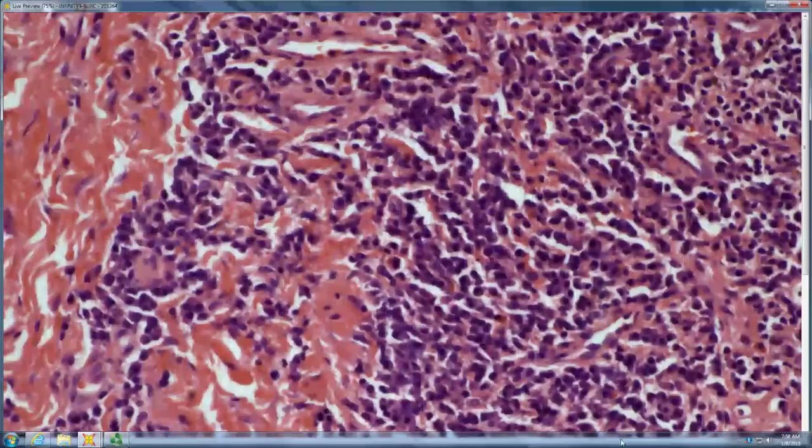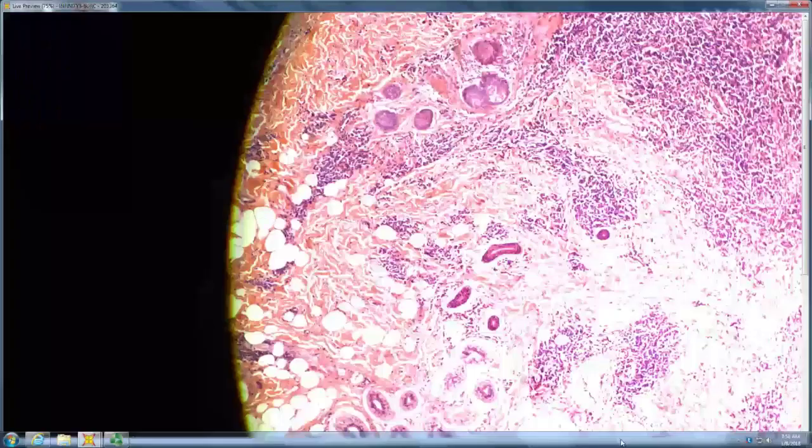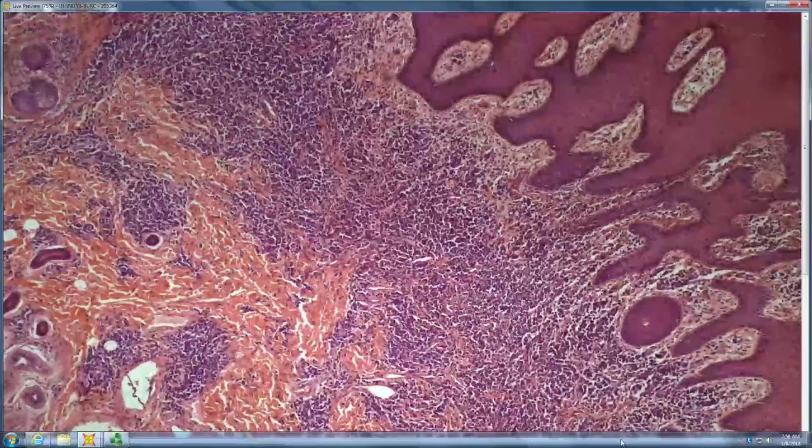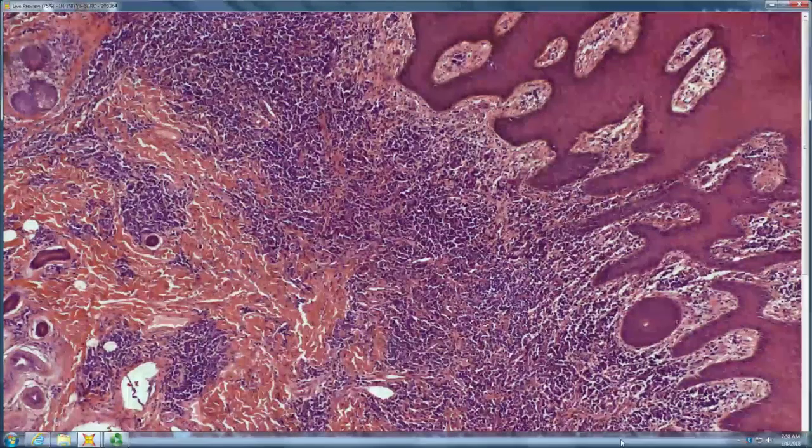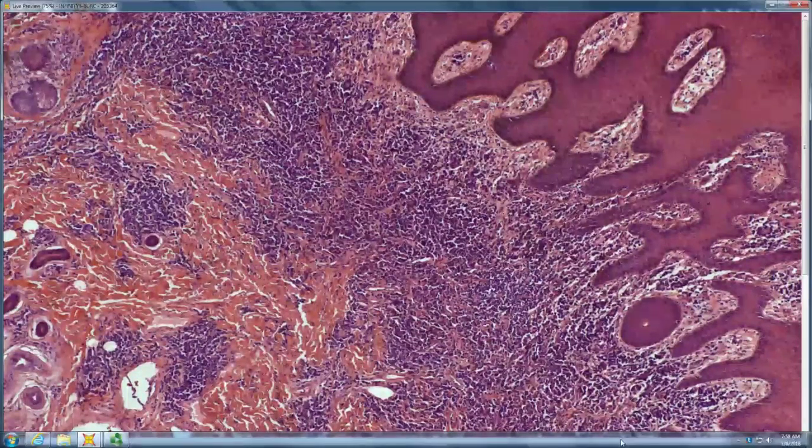And what else do you have? What kind of cells? Plasma cells. Sheets and sheets of plasma cells. They're not melanocytes. But plasma cells and melanocytes are both gray, right? So that's why at scan you knew they weren't lymphs because they were gray, right?